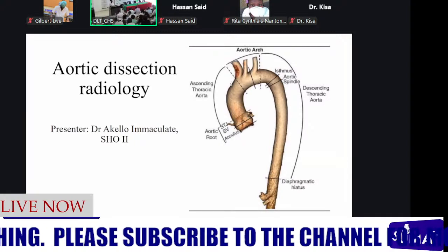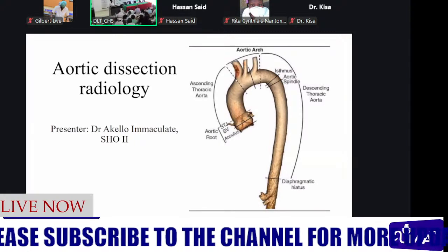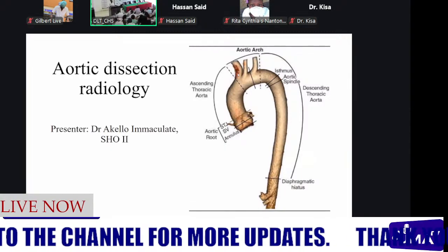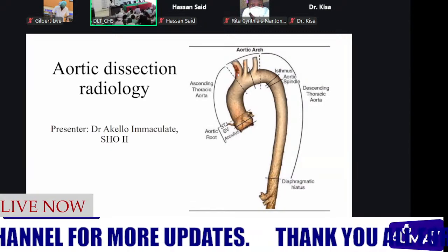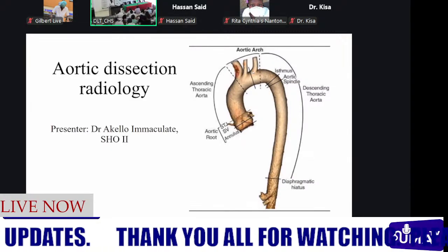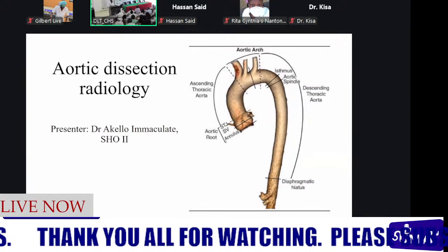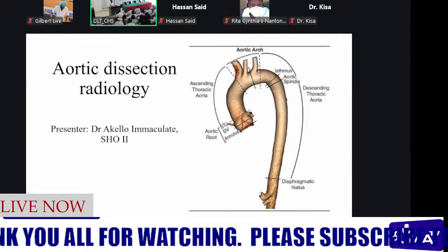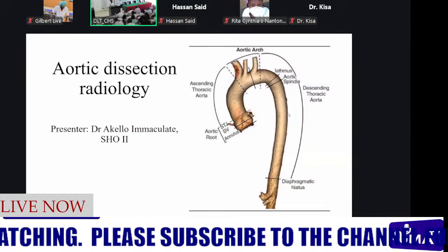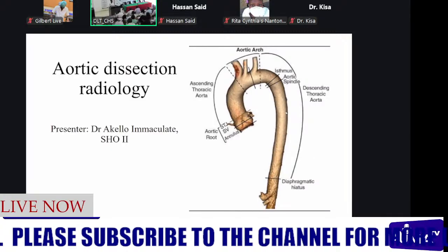Then the ascending aorta extends up to just proximal to the origin of the brachiocephalic trunk, which is the first branch of the thoracic aorta. Then we have our left common carotid, and the arch ends just about 1 centimeter distal to the origin of the left subclavian. Then beyond that, we have our descending aorta.